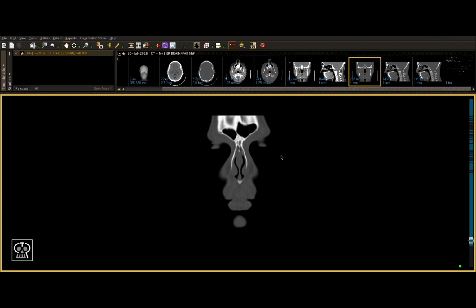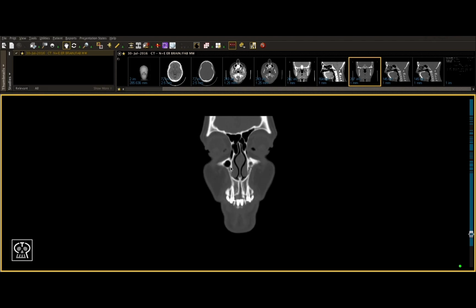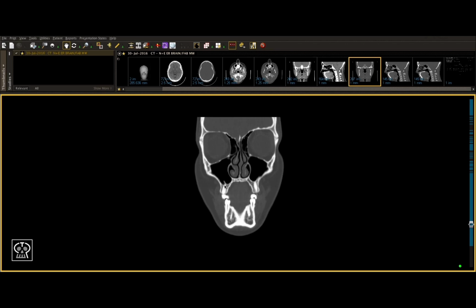The last area I want to mention is the piriform area. It's very important when examining the maxilla to look at your lateral piriform rims here and here. In a Lefort 1 fracture, you may see a fractured line through the lateral piriform rim on both sides. This fracture line may extend posteriorly, starting with your lateral piriform rim, then going transversely above the maxillary teeth in the alveolus, just under your ZM junction, and then more posteriorly through your pterygoid plates, as we discussed previously.